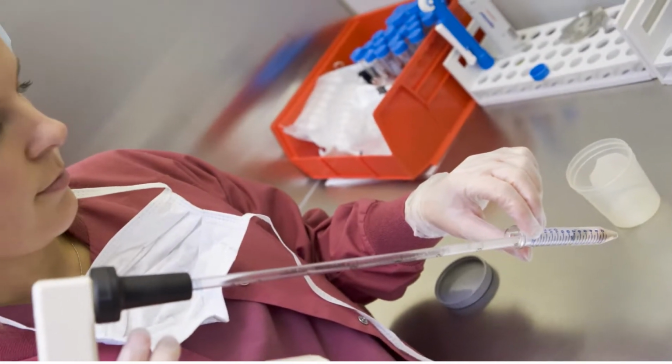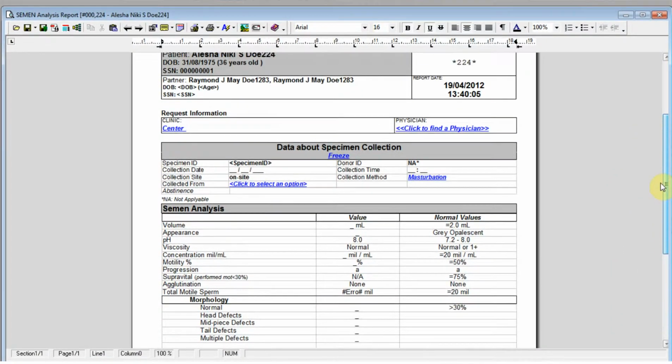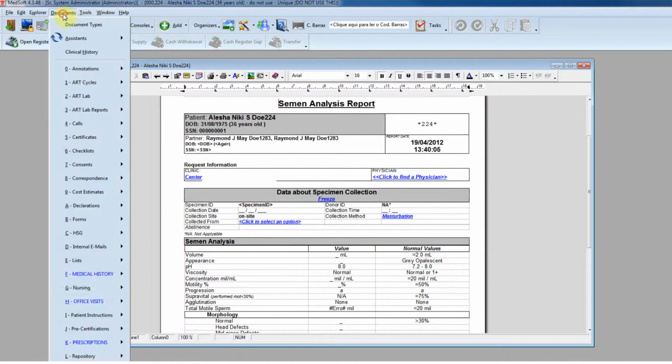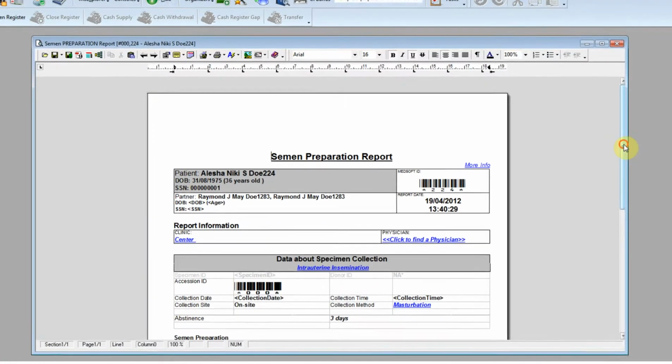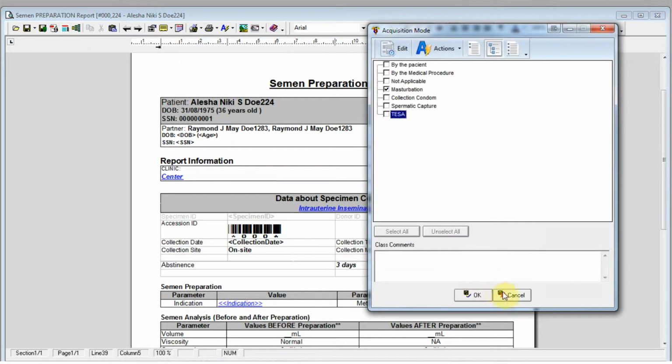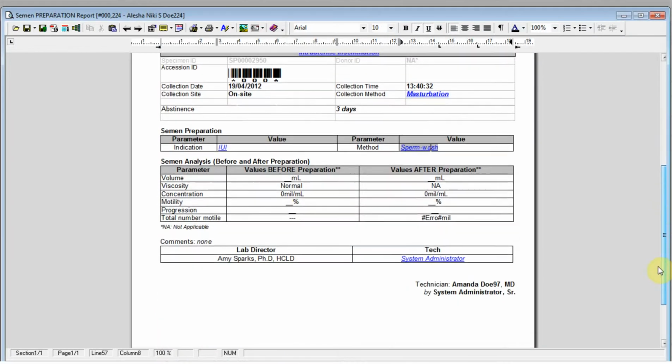Meanwhile, the semen processing stays totally integrated with the eggs and embryos forms, allowing the generation of the complete and reduced semen analysis reports to record the preparation, initially bound with the process of embryo evolution.